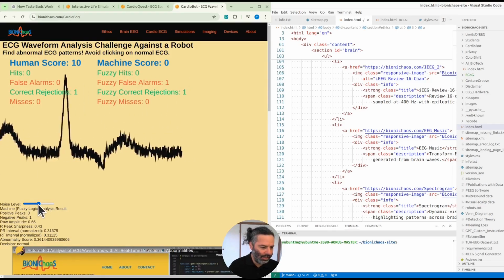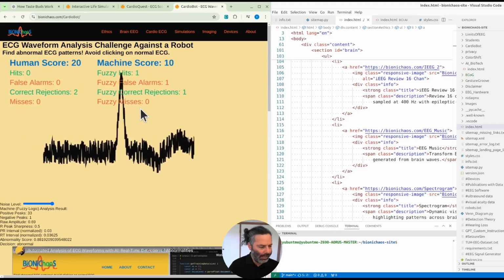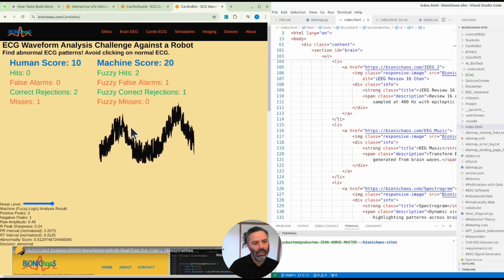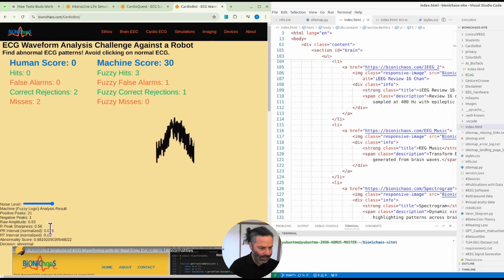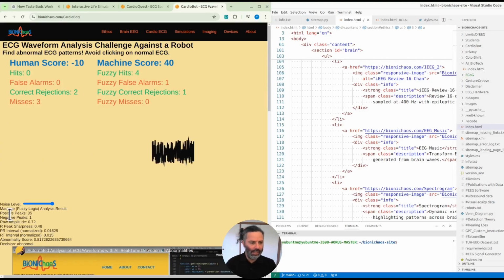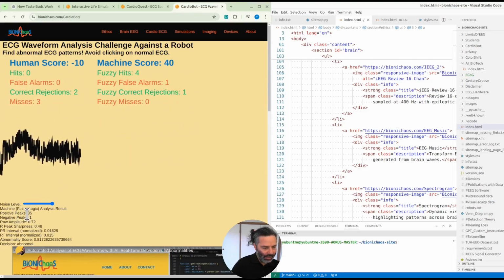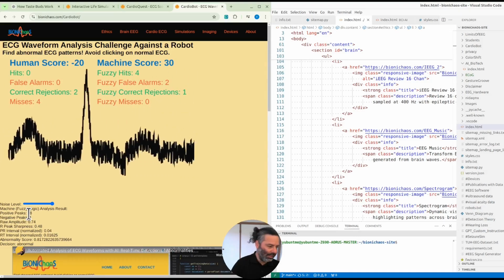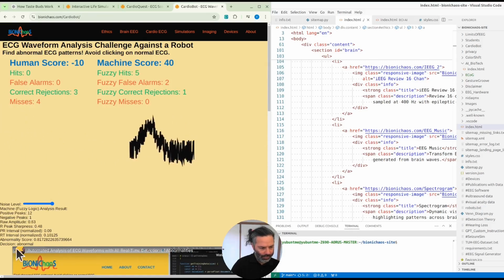You can reduce the noise level and see how essentially an explainable AI algorithm performs. It's a fuzzy logic algorithm. You can see what it's doing at the bottom here. It's essentially looking at the number of positive peaks. So you can see when the noise is increased, it's giving you 35, and it's really sending the algorithm into la la land, and it cannot perform.